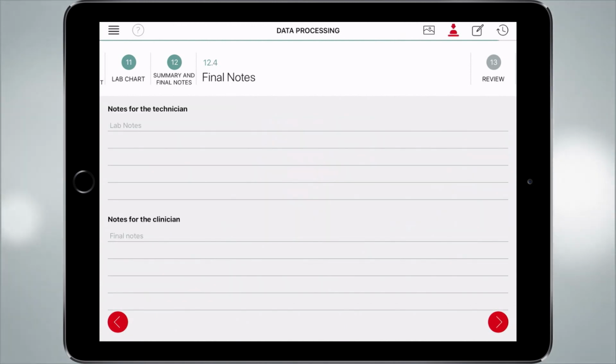So now we have the final notes for dental technicians or for other specialists, and notes for the clinician, for other specialists, for maybe the pediatric surgeon, the orthodontist, the implantologist. So now you can sign what you want. At the same time, you're ready to communicate with the lab the final PDF. That will be great for technicians to receive all this information without inventing anything. We know, from experience, that many technicians have to invent many steps. In this case, nothing to invent. It's already all the data inside, just put it in your work. That's the point.